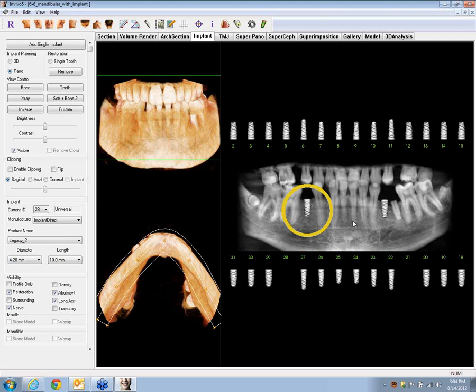we build up a case of 30 teeth here. But one of the benefits of having this is being able to control inventory. If I'm getting ready to place number 28, and I've got a certain implant that I like to lead with, then you don't have to spend any time doing your pull down here. You've got that implant all set and prepared and ready to go. If bone heights are not going to help you support that implant, you'll know right away just by taking a look at this. So it's a form of visual management for you as well.